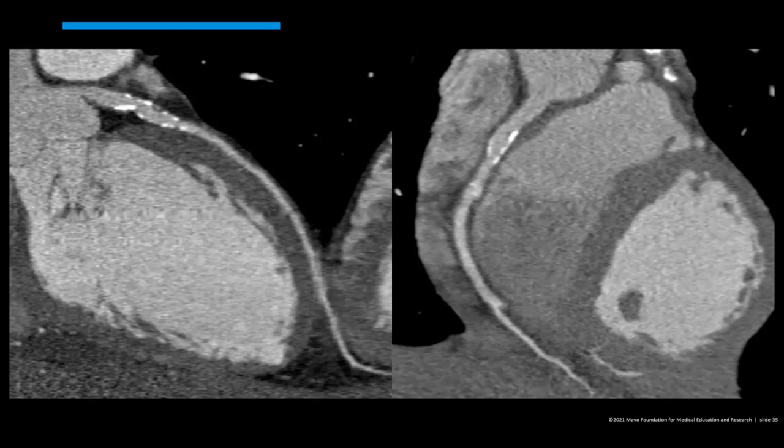If you had cine imaging, the aneurysm would be akinetic or dyskinetic, whereas with normal thinning, you would see some contraction in that area. Great. And while we're on this image, there's also a request for radiology left or screen right on this. If you could review just the anatomy one more time.